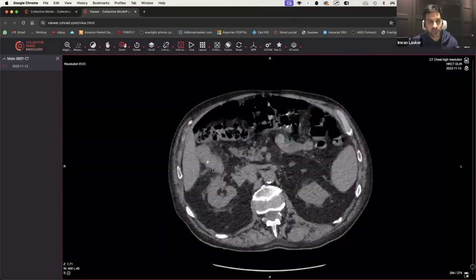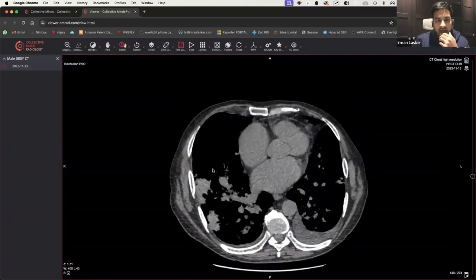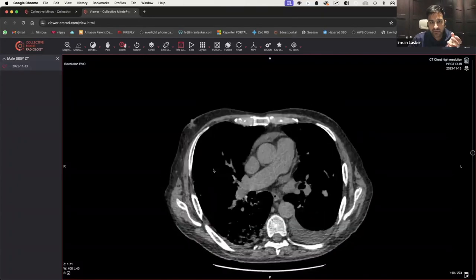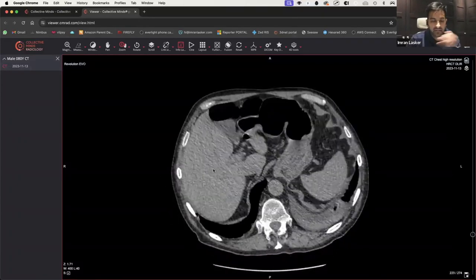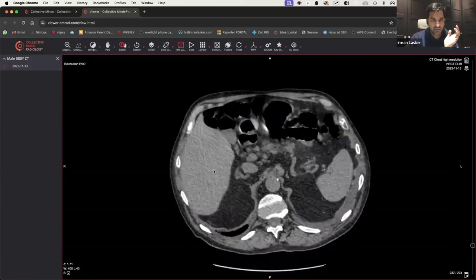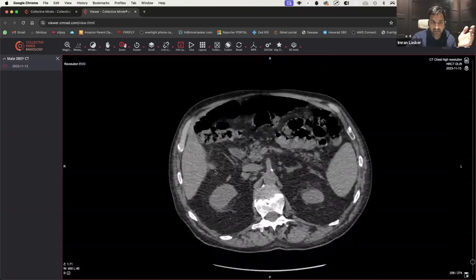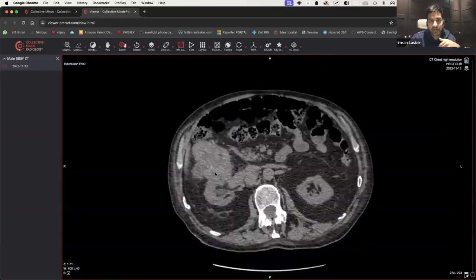Now, the reason why I thought this was quite good is that if you weren't going all the way through, if you just sort of scroll through, you think, okay, cool, looks like infection, leave it at that, then you're going to leave this person with infection. But that's what I noticed, the last slice could sink your career essentially, because literally the last 4 or 5 slices is where there's this clearly abnormal lesion which completely changes the trajectory of the entire clinical picture.